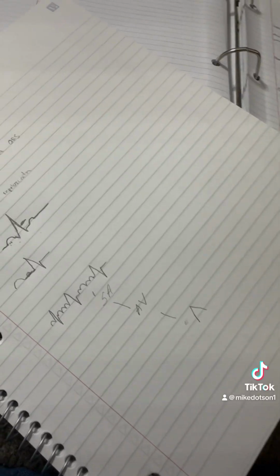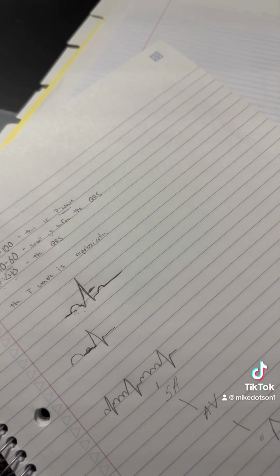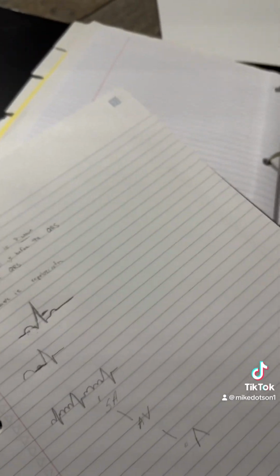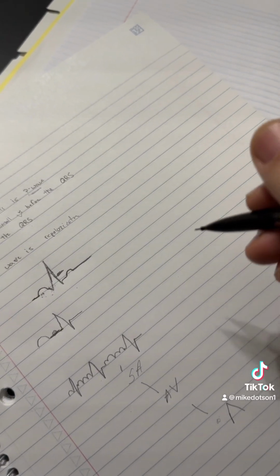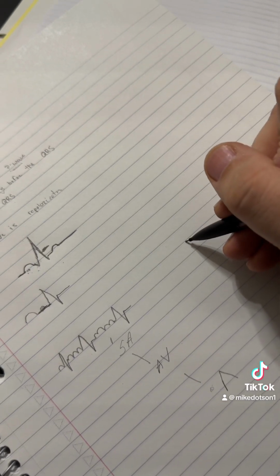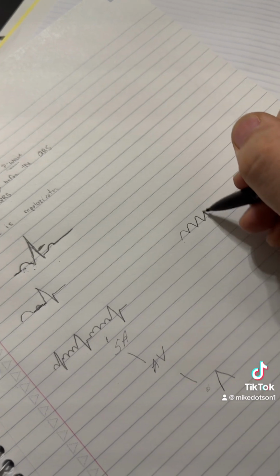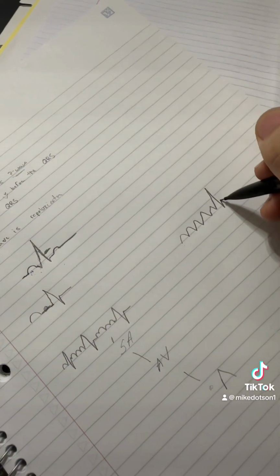Next rhythm we'll look at real quick is one I've never actually seen in person, but you'll see it on tests and stuff, and I'm sure in cardiac you may see more. It's A flutter. It is a regular rhythm, and it has sawtooth P waves. You'll see them. They're very distinguished. It looks like a saw. And then you'll see your QRS.